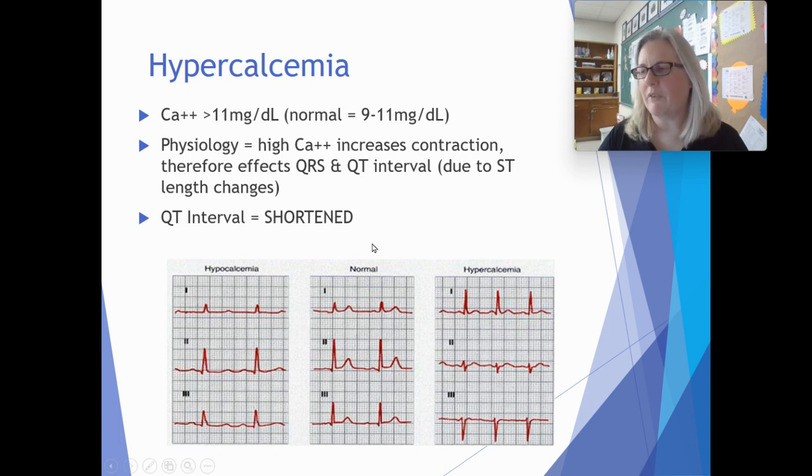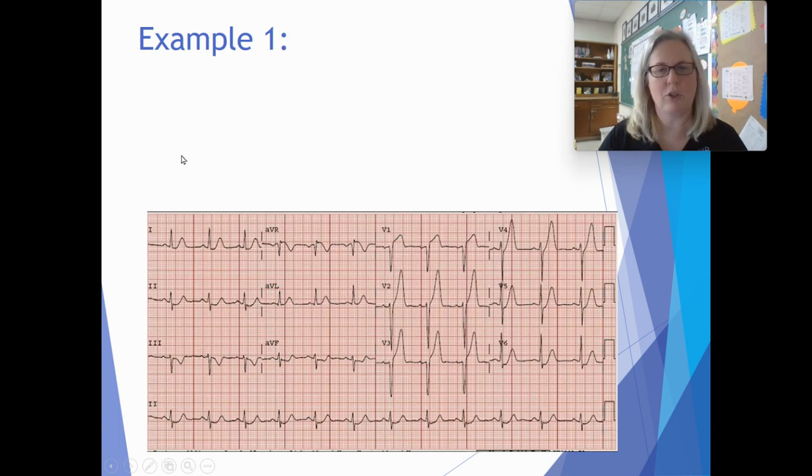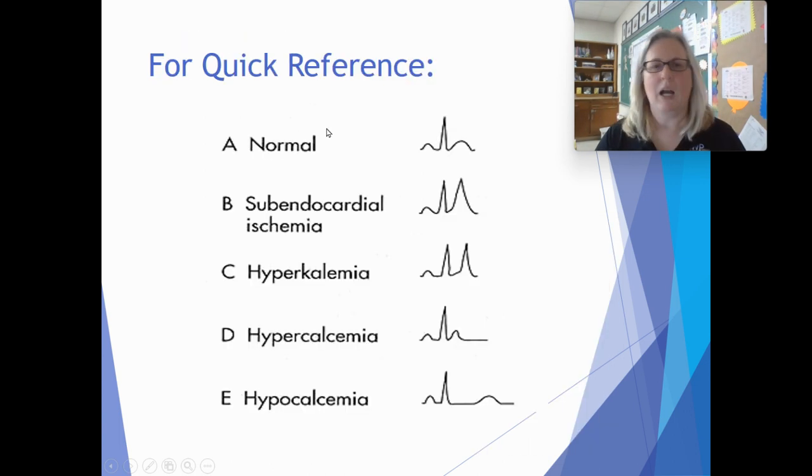All right, so quick reference, this is kind of what they look like. It's normal. And then we have ischemia, hyperkalemia. My bad. You can see that these all look very similar. Ischemia and hyperkalemia look almost identical.